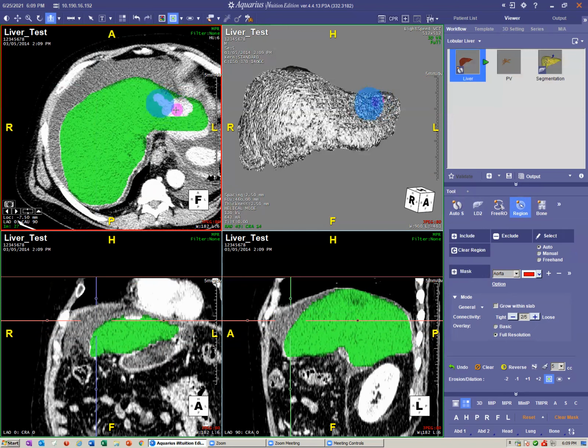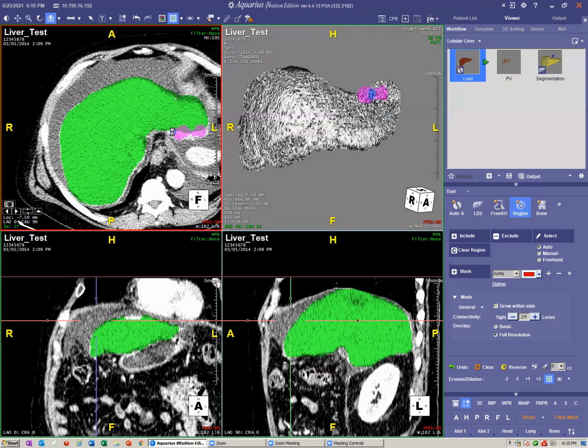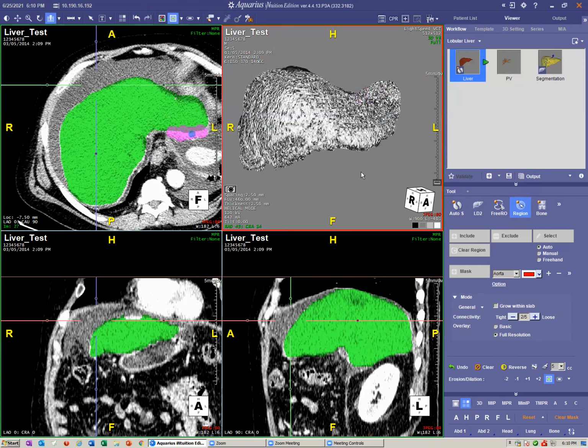And by the way, once you're Control Shift left clicking here, you can use the scroll wheel to make the circle of your highlighting smaller, and then bigger in the opposite direction. Include that. Include. All right, so forth and so on. And it doesn't have to be one contiguous growth, by the way. You can let go of the left click and spot highlight areas and then include.